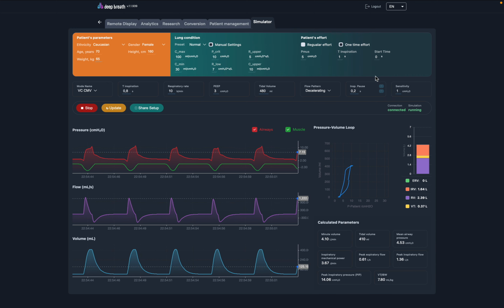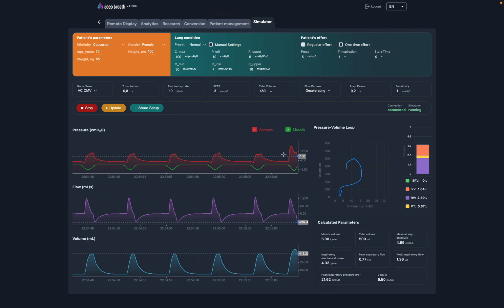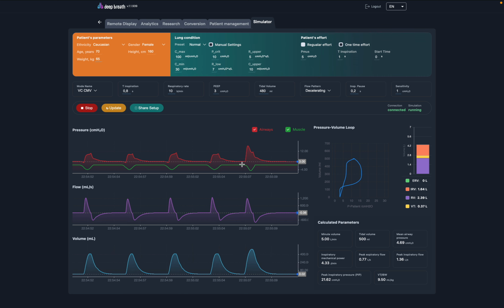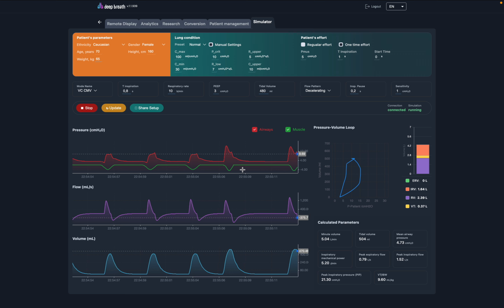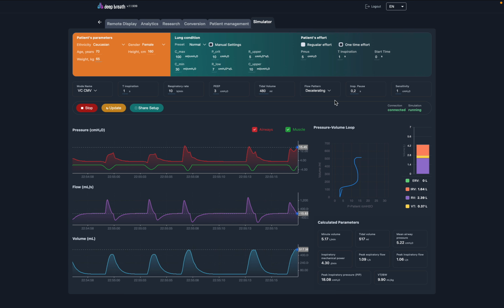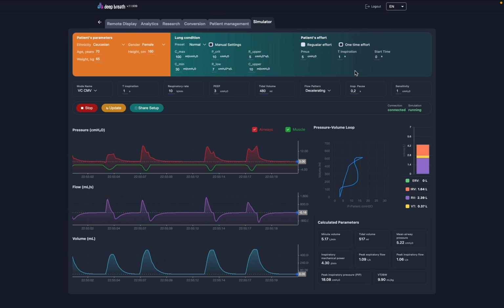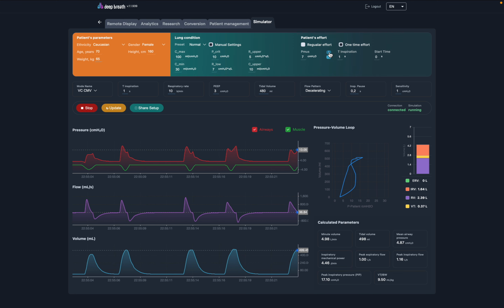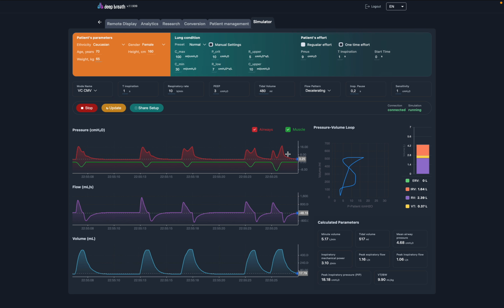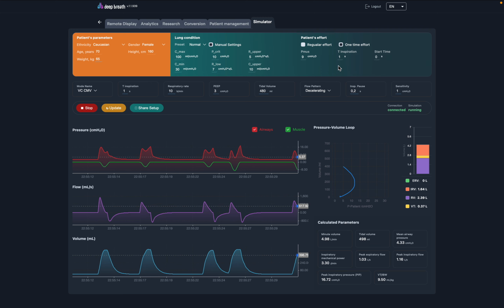So if I click here 0, it will be at the same time as the ventilator. So patient and ventilator start simultaneously, and like now they will end simultaneously. So pure work shifting. So very easy. We can make it more severe, also to see how it will look, etc. And that's one of the options.